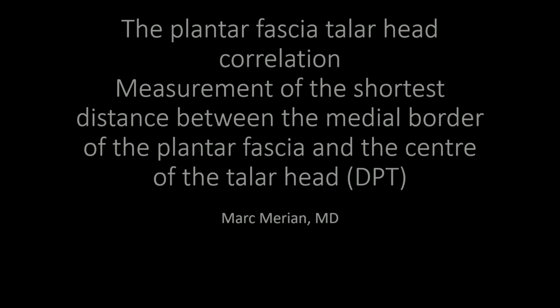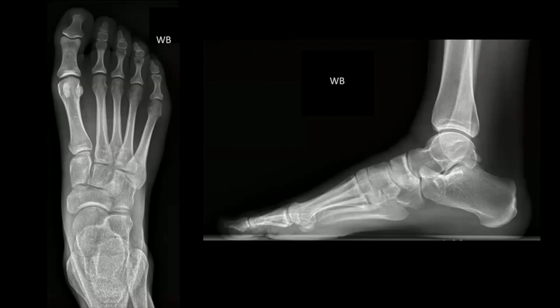For the measurement of the plantar fascia talar head correlation, you will need a dorsoplantar and lateral weight-bearing radiograph of the foot. The dorsoplantar radiograph should include the entire calcaneus, and the X-ray beam during acquisition should be 17 degrees posteriorly angulated towards the heel.